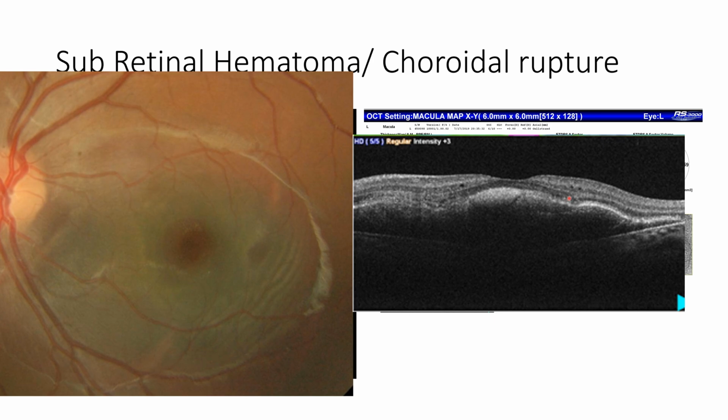And we can make out that when we do our OCT, we find the retinal tissue is nearly normal. We have a foveal dip also. We have a few cystic spaces. And then we have the retinal pigment epithelium, which is grossly elevated in this area. And then we don't see anything because this is filled by blood and there is no signal which is able to pass through this opaque blood. So we have a shadow here.